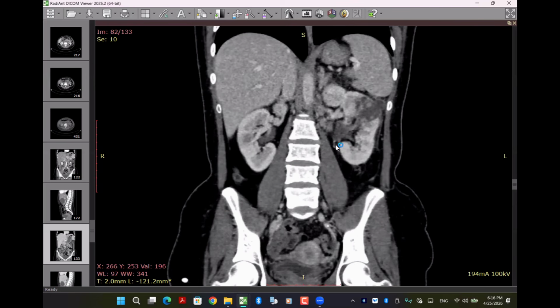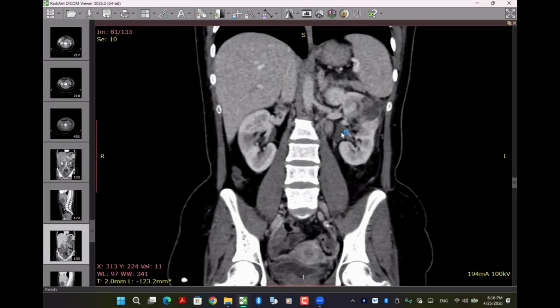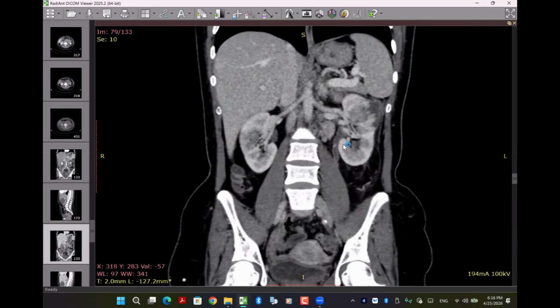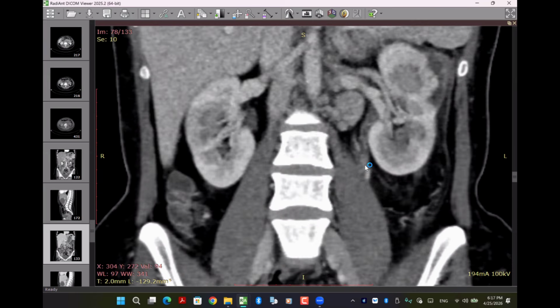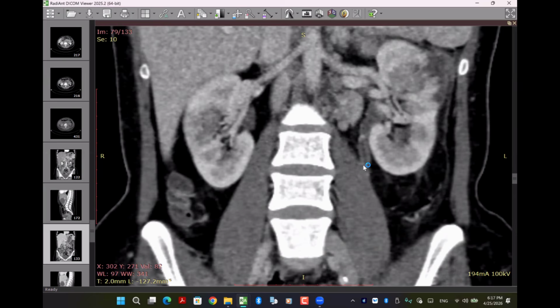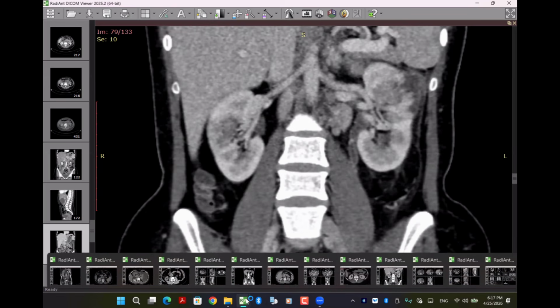And if it is pyelonephritis and it is extending like that, you should ask for the delayed phase. I can see there is enhancement of the ureteral lining of the left ureter, suggesting some element of ureteritis also. Nice. You are doing very well. Thank you for this participation, and we can shift to candidate number 4, I guess.